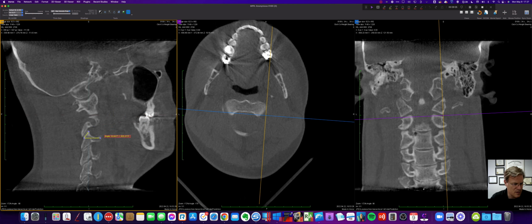Copy, paste 1, 2, 3 times, grab them, pop the angle part on the back part of the lower, not the lower joint, but the superior margin of the lower bone. Good. Shift, hold the shift down. Take a screenshot, boom, and those are my measurements for the right side.